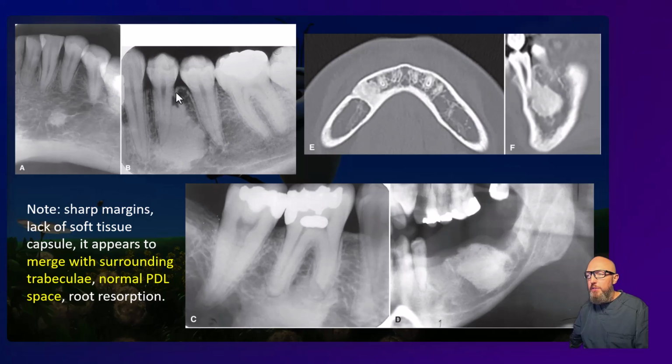All right, you've seen these images before. Hopefully right away you can start recognizing this. Is this condensing osteitis or is it idiopathic osteosclerosis, aka dense bone island? All this is that dense bone island, the idiopathic. So this is the I from the TOFIE lesion, which we've covered before, so we didn't cover in depth in this lecture. This is an axial slice. You see this well-defined, very dense, almost homogeneous, although there's a little mixture to it. Opacity. All of these are just idiopathic osteosclerosis. Here's a localized hyperdense, although this is somewhat mixed. Idiopathic osteosclerosis sometimes can be a little bit mixed.